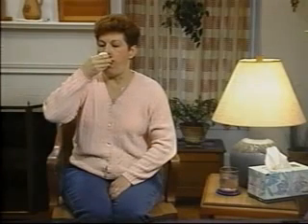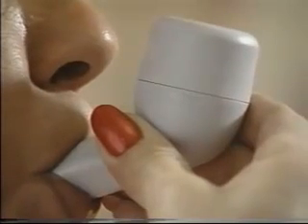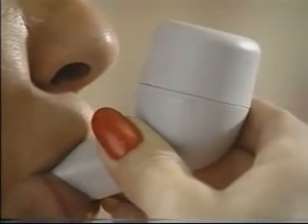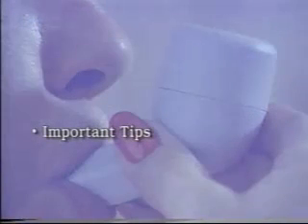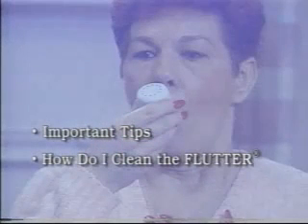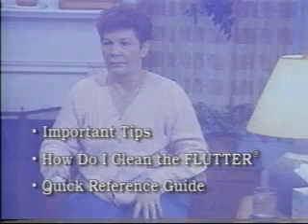Remember, the primary goal of airway clearance therapy is to comfortably and efficiently remove as much mucus as possible. The flutter will assist you in achieving this goal. Refer to your patient instruction manual for complete usage information. Read the Important Tips section for additional ideas on how to ensure successful flutter therapy. Review How Do I Clean the Flutter? Because with proper care, the flutter will provide years of beneficial use. Finally, the patient instruction manual contains a quick reference guide to detach and carry with you.